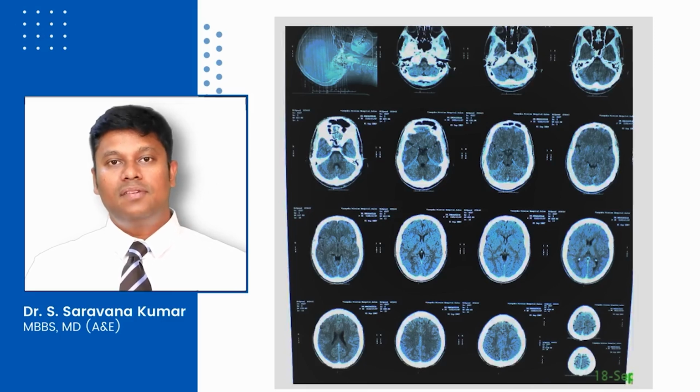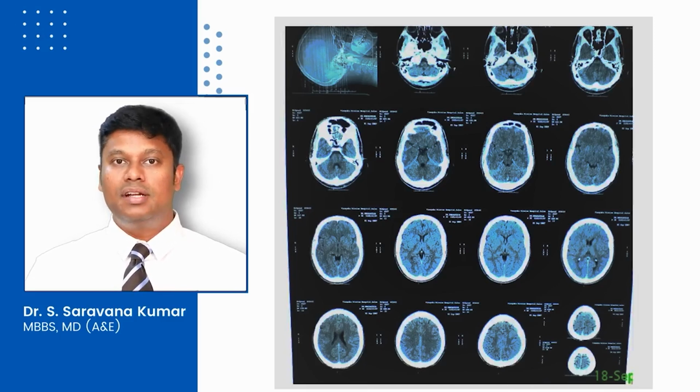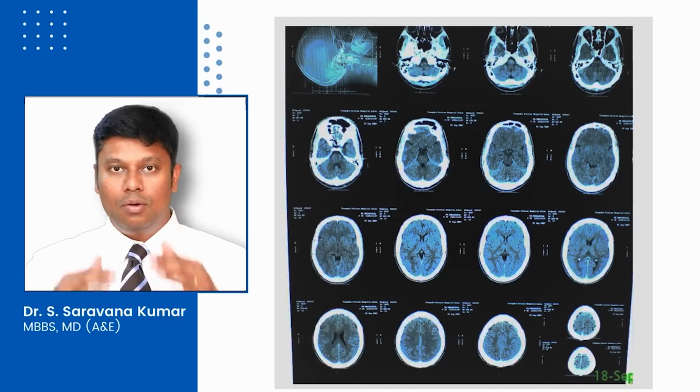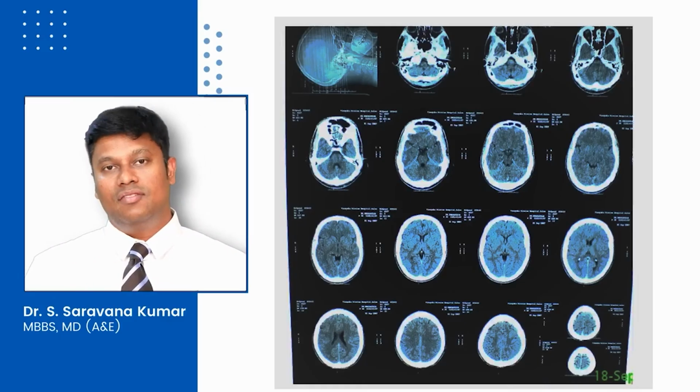The key to identify the parts of the brain stem in a CT scan is actually to identify pons. How do we identify pons? Remember those middle cerebellar peduncle structures? They look like a horseshoe. In other simple terms, you can remember it like how a tooth and its enamel look. Search for that structure in the CT films.